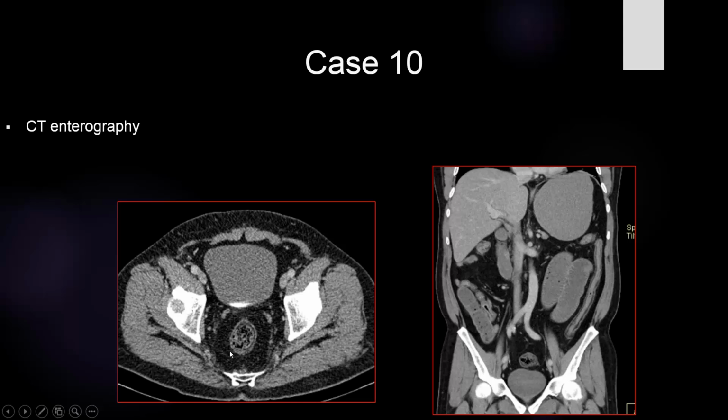And also there is some sort of hypertrophy of the mesorectal fat plane surrounding the rectum. This is one of the characteristics of ulcerative colitis. The fat plane in the mesorectal space and the mesorectal fascia here is prominent and hypertrophied, and again this is one feature of ulcerative colitis.